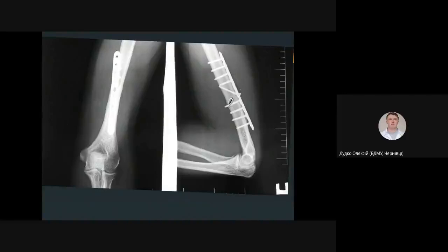As we have a stage of remodeling, you don't see clearly a fracture line here, and we know that the fracture healed and we can remove the metal device. Perhaps it was an oblique fracture, because for this technique usually a special lag screw is inserted.